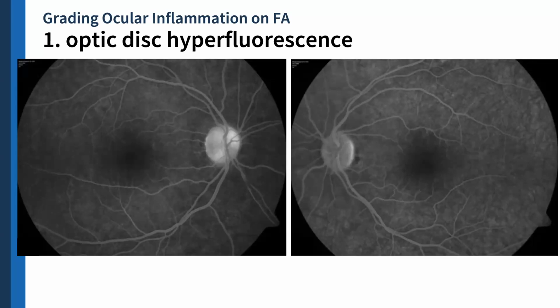On the right. On the left side. Which eye is normal? Which eye is abnormal? The right is the abnormal one. Perfect. Fluorescent. So the left eye, yan yung normal one. Yes. Yeah, so that's correct.